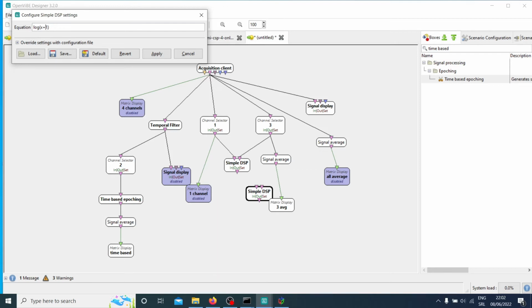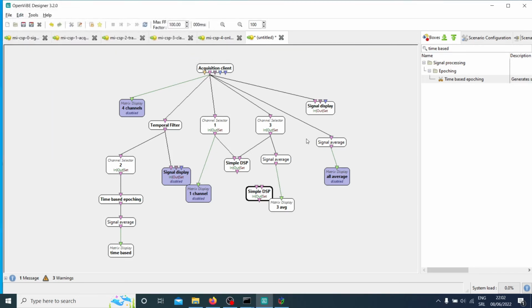Then you just want to put +1 inside. You don't want to say, oh, I want only the positive values of a log function. If you do something like that, like one of my students did, it doesn't work. This just gives you a true or false value, a 0 or 1 at the input. It won't give you a logarithm. It won't give you a continuous function. It will just give you 0 or 1. So be careful not to do that.